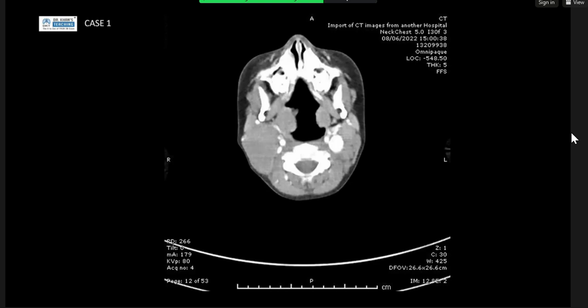Okay, so if I give you a bit more information, this is a girl. She is 7 years old. A bit of weight loss, appetite loss, but nothing specific. Does this change? Yes, I will go with the lymphadenopathy more. I will go with lymphoma. Would this be lymphadenopathy from lymphoma, as a result of weight loss at this age? And would you do any further imaging to confirm what this is? Because you gave me quite a few earlier. Okay, I think I will go to MRI with contrast.